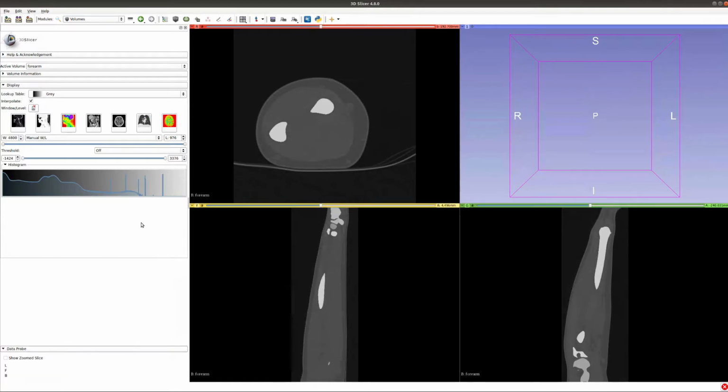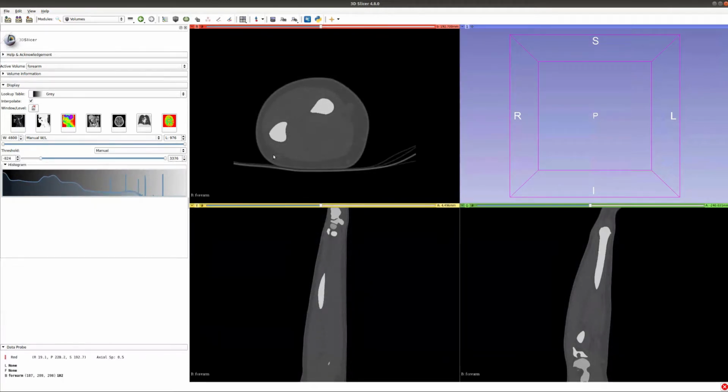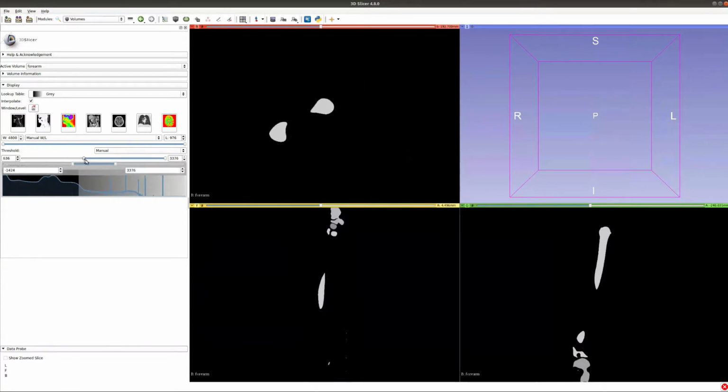And here we see why the Otsu method might not have worked for our purpose. It probably found a threshold over here somewhere, so it just had the background and then the full forearm. Whereas it should have found some threshold all the way up here, at maybe around 1000. That seems like that will segment the bones nicely from all the tissue and the background.